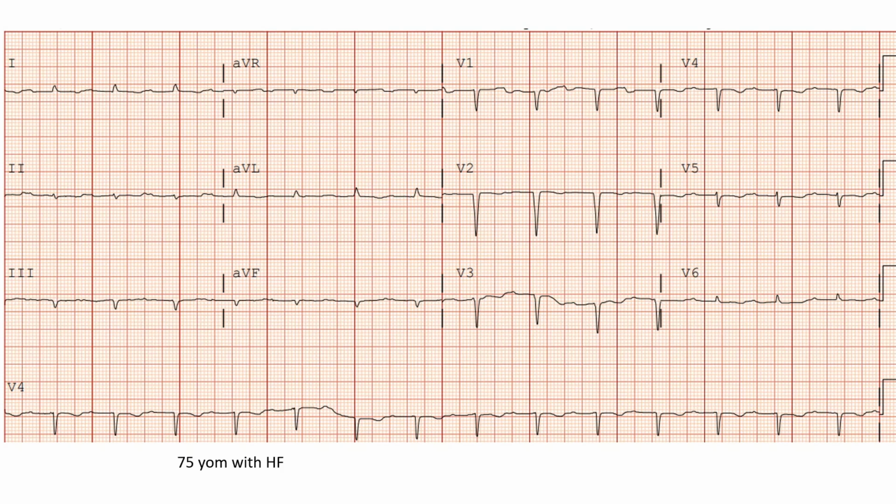Anterior and inferior MI? If you have an infarct from an LAD, especially mid-LAD, you get an apical infarct. Those are the patients where you get acutely diffuse ST elevation, and chronically you get diffuse Q waves. You get them in the anterior and in the inferior leads. It's an LAD that wraps around the apex. So you get injury in all leads because the apex looks at all leads. So it could be that.